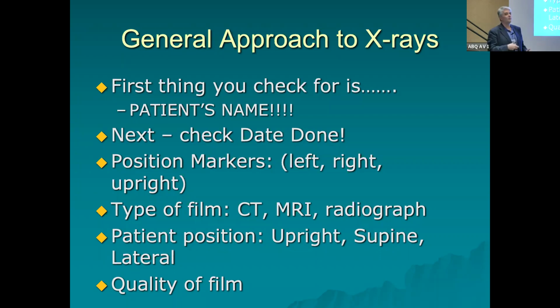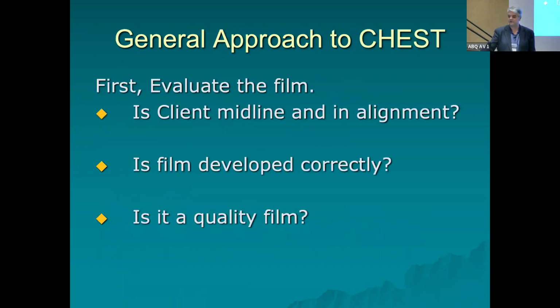Note if they're upright or they're laying down or they may be on their left or on their right, that will also determine what type of pathology that you see. Okay, look at your type of film, the position, and make sure it's a good quality film.